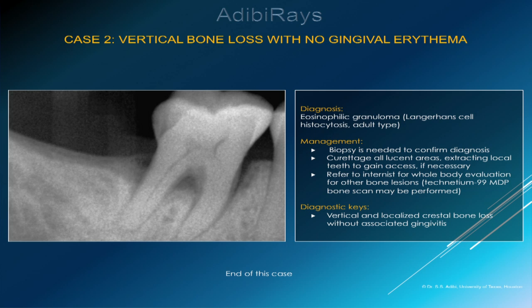The key diagnostic feature in this case was the unexplained localized crestal bone loss without other associated periodontal or gingival conditions.